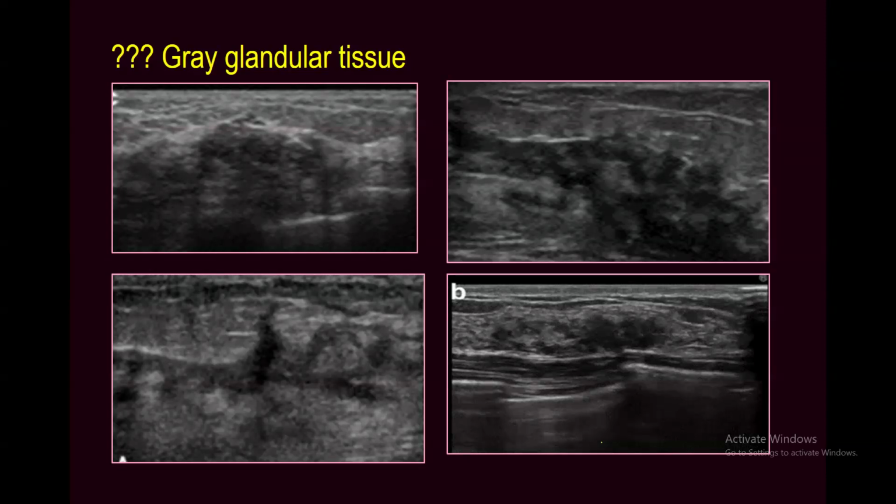Most non-mass like breast lesions are sometimes asymptomatic, and sometimes can be discovered in a screening study, or can be symptomatic but not necessarily palpable, but at the end represent pathology. And not only pathology, most of the cases represent DCIS or invasive lobular cancer. Rarely do they represent fibrocystic changes.